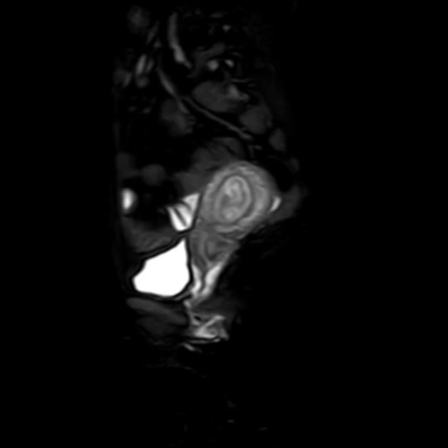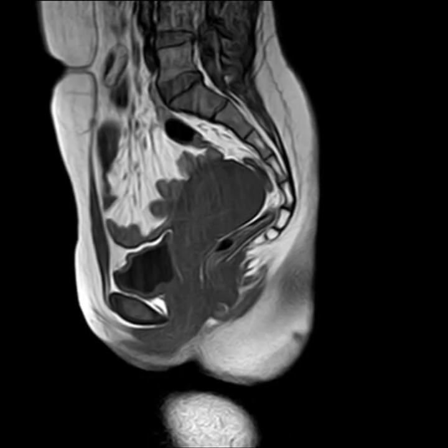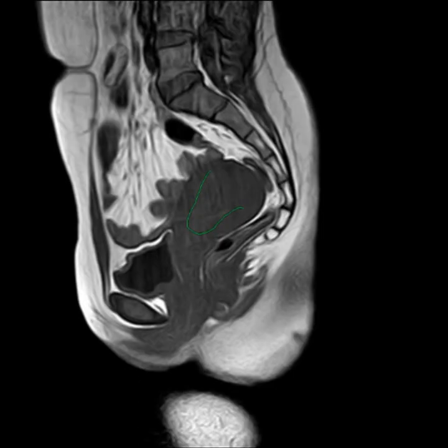Excellent. So what else? Probably T1 weighted images will be helpful to give us some more details. Yeah, sure, why not? So these are T1 non-fat saturated images, and we can see that the lesion that we discussed before is isointense with no real hyperintensity, so probably there is only minimal hyperintensity here, which indicates blood as the patient complained of vaginal bleeding. So now I want to give contrast to see the pattern of enhancement of the lesion.